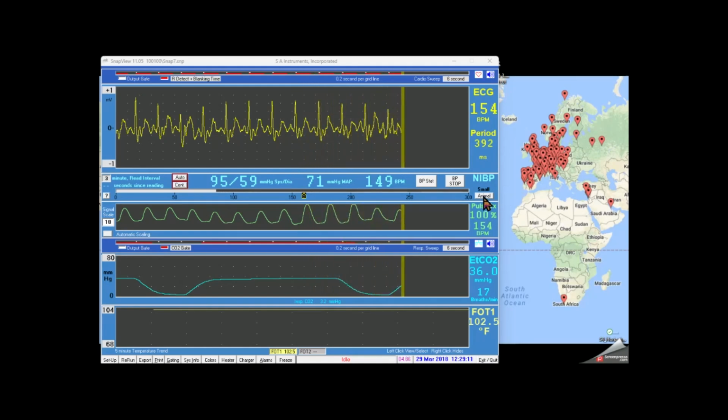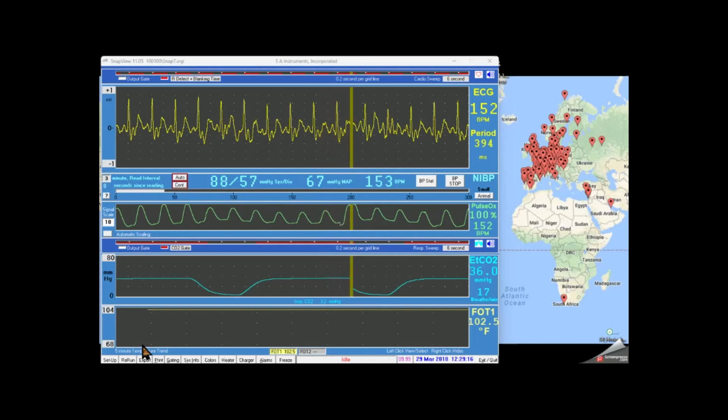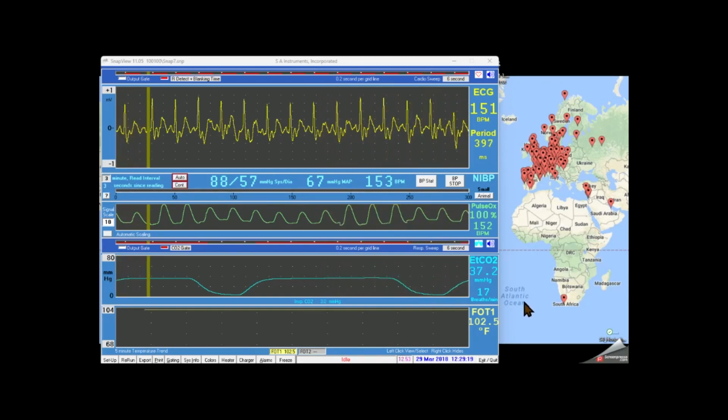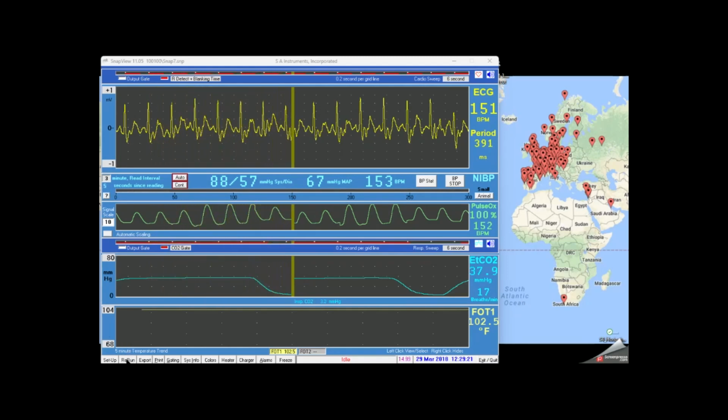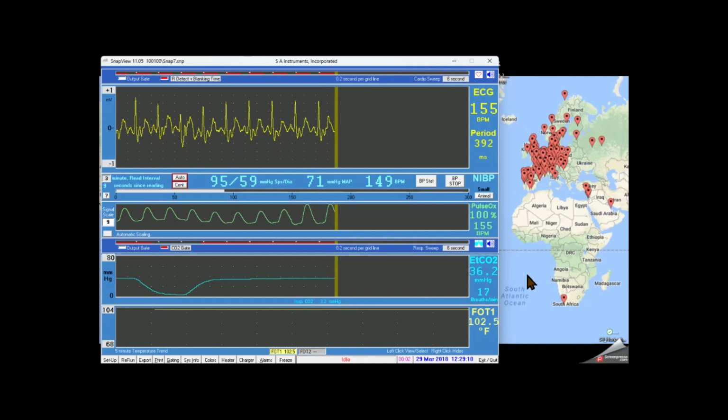One difference is the keys in the lower left. In PCLAM they were snapshot and trend. Here they are setup, rerun, export, and print. We only have 36 seconds of data. But by right-clicking on the rerun key, playback will automatically restart after 36 seconds.